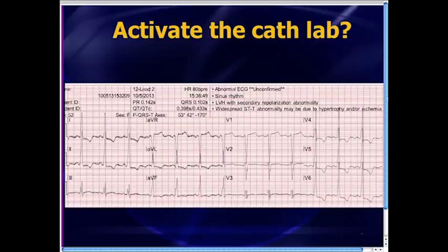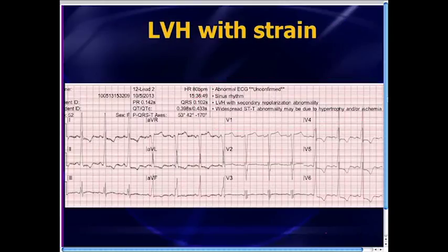Now, in the past, I've always said that I'll never show you an EKG interpretation unless it's wrong. But in this case, I have to tell you that the EKG interpretation was correct. Actually, it was a bit of a hedge because it said LVH and it also said maybe ischemia. So, the EKG interpretation is completely useless. So what do you do? Well, there's a handful of things that you need to know about LVH which might allow you to call the patient's EKG a strain pattern.